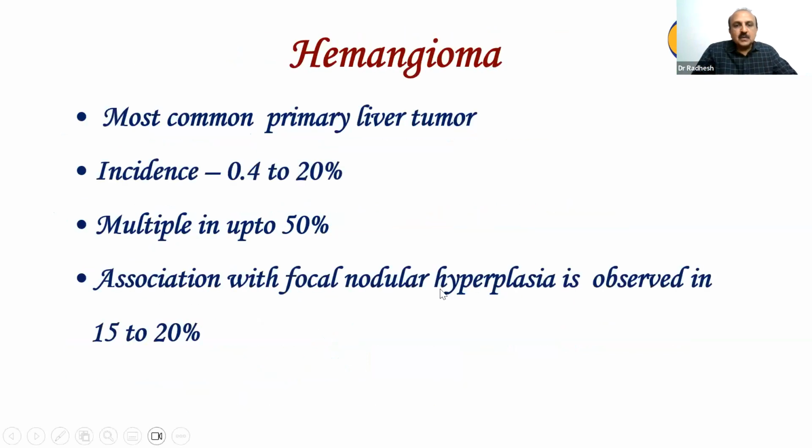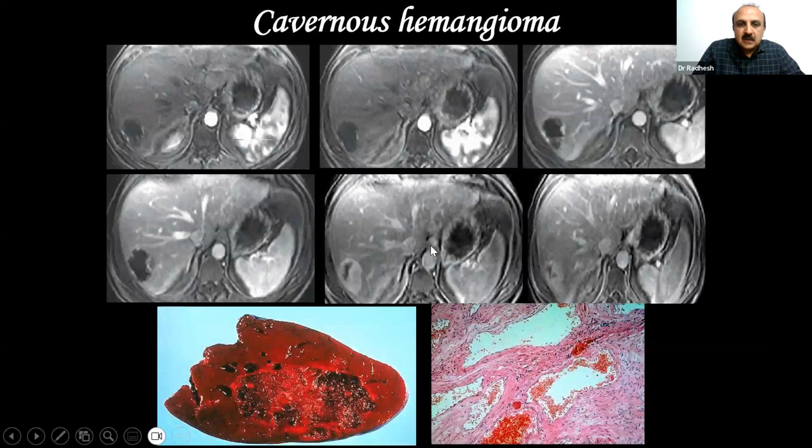Now, let's go to a few conditions. Okay, so let's look at hemangioma.